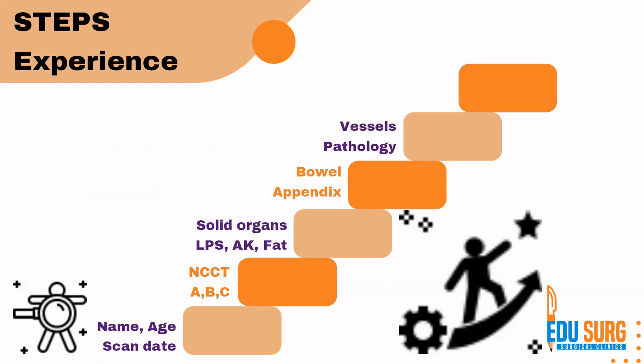Once you have finished these steps, you have finished the organs, hollow and solid, NCCT, then look at the vessels and then focus on the pathology. If there is a pathology, like I said, you need to stage the pathology or look for complications of a particular disease process. Once you have seen all of these steps, that is when you can go into planning surgery or planning management for your patient. So this is a stepwise approach that we follow.